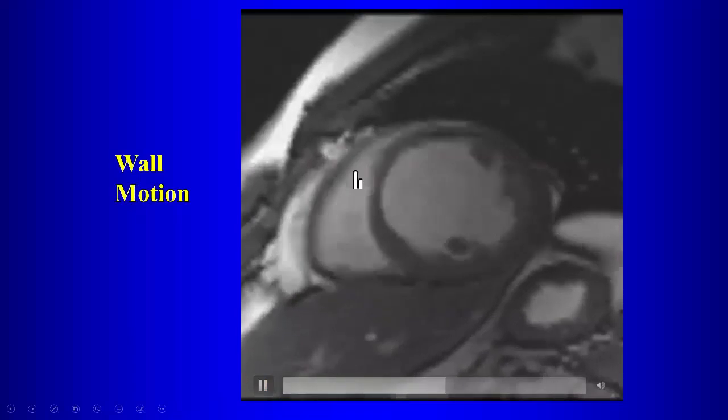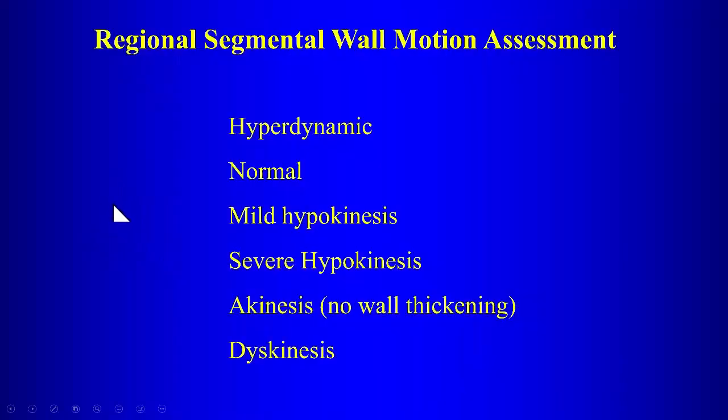Yeah, so this is an infarct in the distribution of the LAD, and we could also see on the initial image that there's a little bit of atrophy here in the myocardium, telling you that this is a chronic infarct, okay? So this confirms that we have an infarct in the distribution of the LAD accounting for the wall motion abnormality.